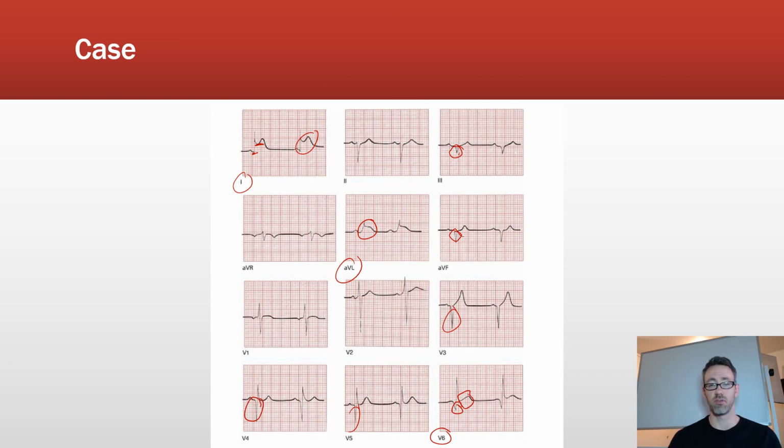So they're definitely having so far an acute MI in the left lateral aspect of the heart, which is probably being provided by the left circumflex, for example. Now, the Q waves are basically in the anterior leads as well as the lateral leads. And so what that suggests is there was an old infarct in the anterior aspect of the left ventricle, as well as an old infarct maybe in the left lateral aspect of the ventricle. So there might be some dead tissue in that area as well. So this was probably a fairly sick heart that has had MIs in the past.